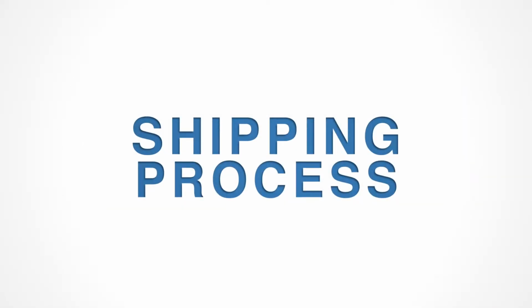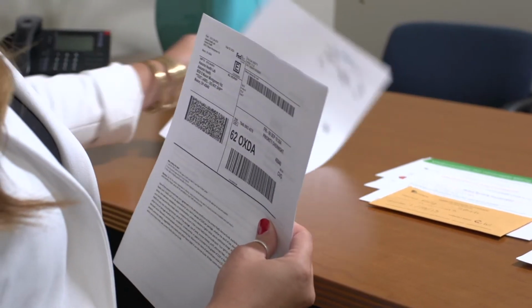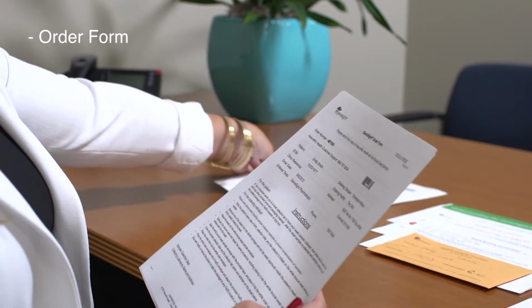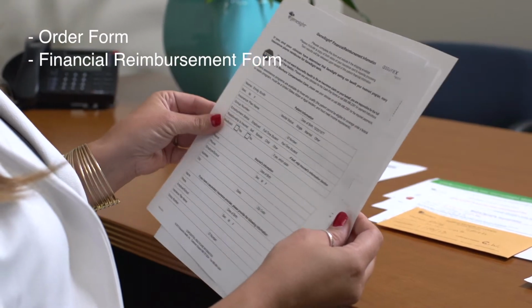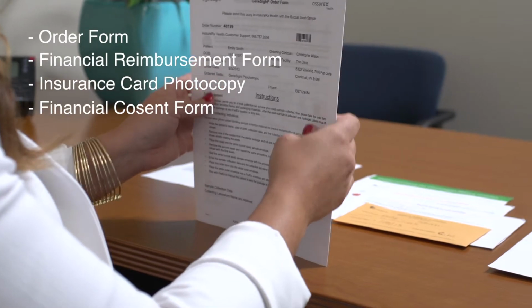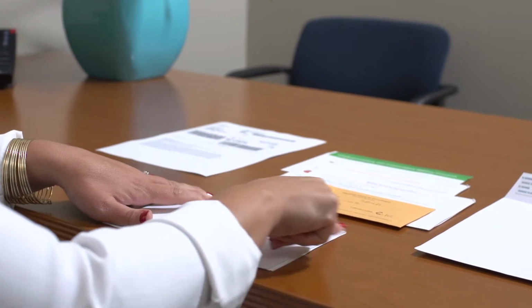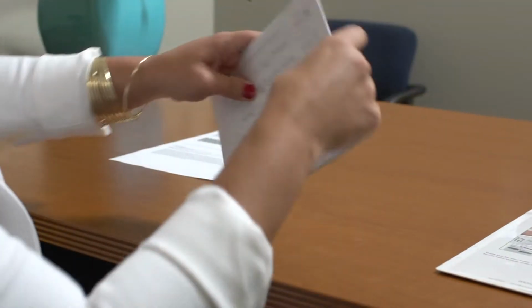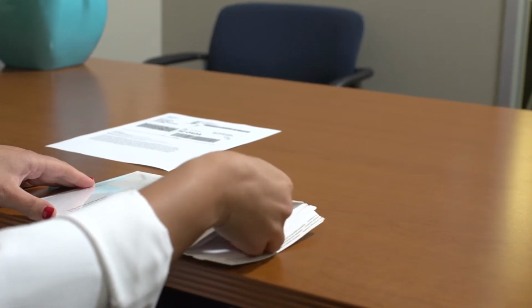The shipping process. With the collection process complete, check that all required documents are prepared and ready for submission. Be sure to include the order form, GeneSight financial reimbursement form, a copy of the patient's insurance card, patient financial consent form, and medical necessity form. Each document is crucial in processing the sample and assisting with reimbursement. Place all required documents and the swab sample envelope in the shipping envelope and seal it.